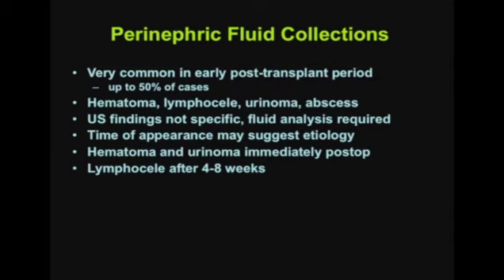However, the timing of the development of the fluid collection can suggest the etiology, with hematoma and urinoma generally occurring in the immediate postoperative period, whereas a lymphocele usually has its onset after about 4 to 8 weeks.